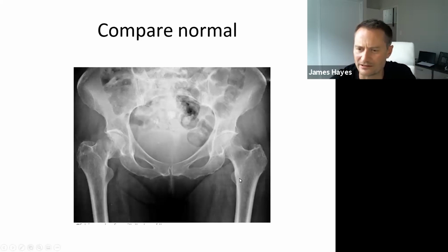And then you say, okay, so there's no reason a radiographer, unless they couldn't be bothered, wouldn't ask the patient to sort of straighten their legs unless they had a pathology. Or the patient said no, because it hurts, and that's why I've come into hospital. So you say, well, what's the other reason that this might happen? And you look at this nice long neck of femur here, and you sort of say, well, it's a bit munted on this side. That's not an actual medical term. But you can see this jagged edge here.